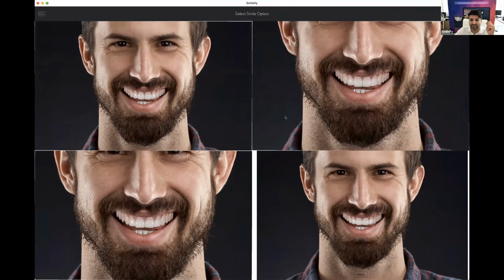Second question. We do have the dominance of the smile, which is a very, very powerful feature in my opinion, because it changes the facial harmony and the facial energy completely between a monotonic smile, where the laterals are just lying on the same smile curve like the centrals and the canines, or we can make the smile more dominant by reducing the size of the laterals, making them a little bit shorter.